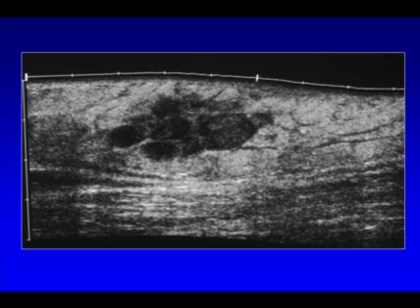Here's an example of a very nonspecific lesion that biopsy was needed to make a diagnosis. This is a patient who presented with a mass on the thigh. We put the ultrasound down and we saw this lobulated mass. It looked somewhat solid. It did have acoustic through transmission, but again, not a helpful sign in the subcutaneous tissues. There was a lot of hyperechoic fat around it, so it looked like the body was reacting to it. But we really didn't know what it was.